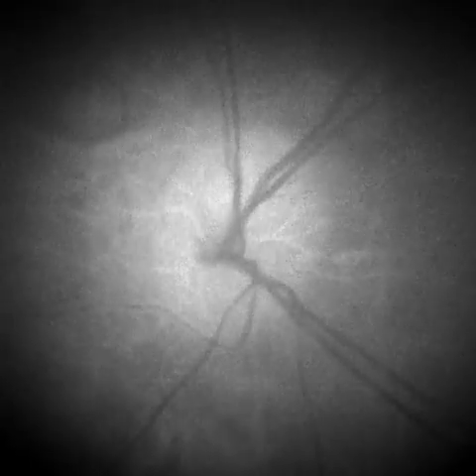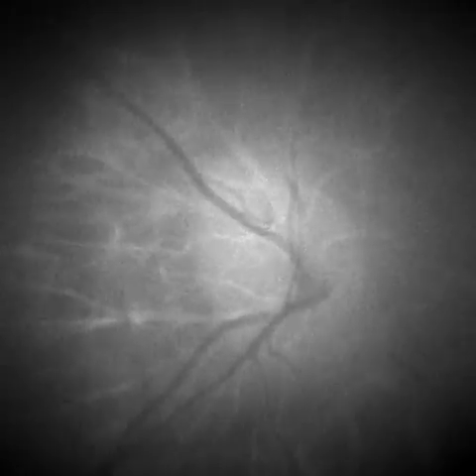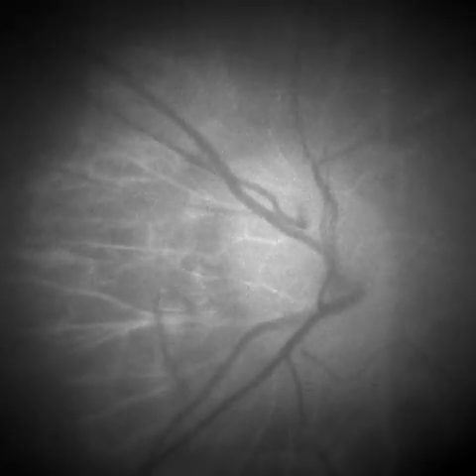Each frame batch undergoes a 2-step parallel processing. First, a spatial transform creates a hologram from each recorded interferogram. This operation is applied in parallel for each frame of the batch via the cuFFT data shaping function cufftPlanMany. The critical part of wave propagation, which creates a hologram from each interferogram, is computed by a fast Fourier transformation with cuFFT in 0.97 milliseconds.